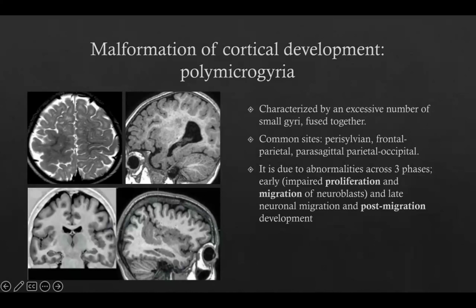If you look at the bottom image, there is polymicrogyria as well. Look at the perisylvian region, it's a bit more busy here. So you see thickened and shallow cortex compared to the normal one. If you look on sagittal, again you see this polymicrogyria along the Sylvian fissures.